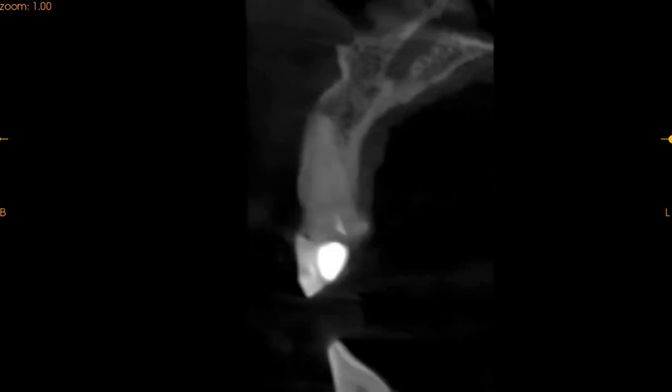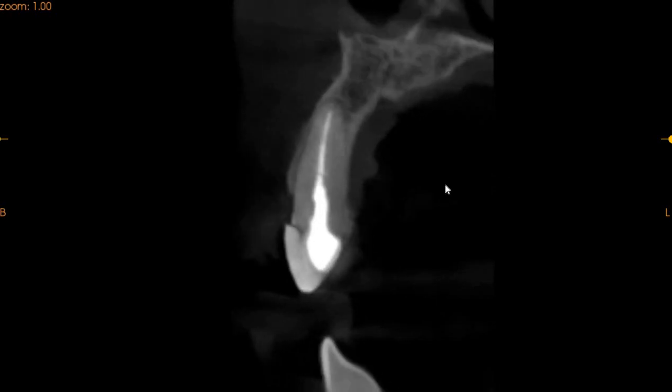Now moving to the upper left lateral incisor, this is the one which seems to have no radiolucency. The obturation is not as radiopaque as the central, but definitely no voids can be seen. So this tooth is doing absolutely wonderful.